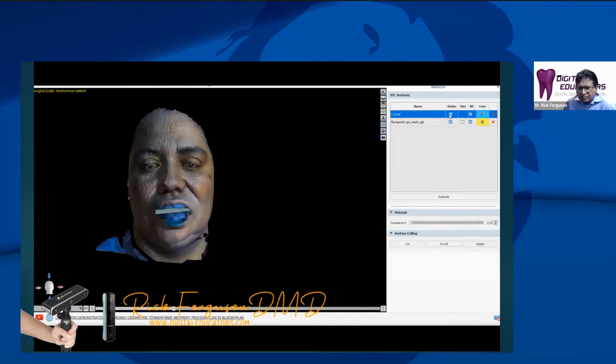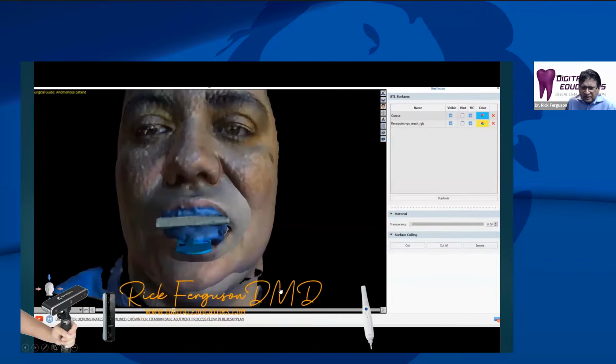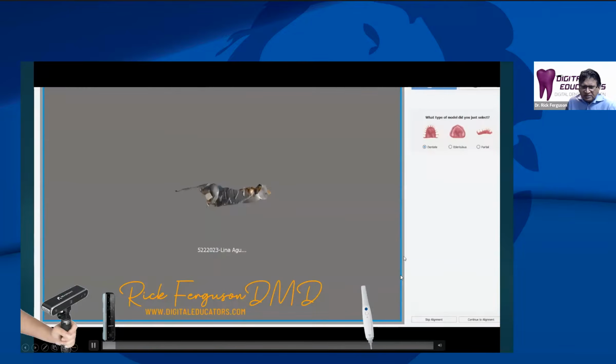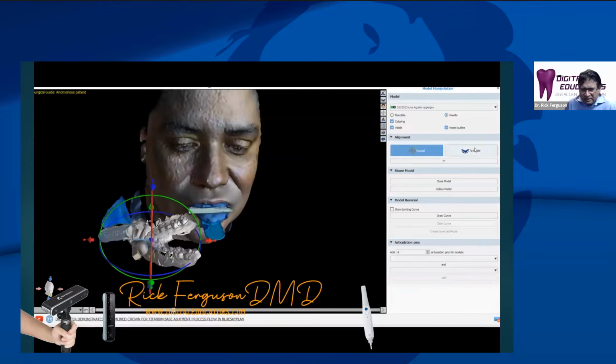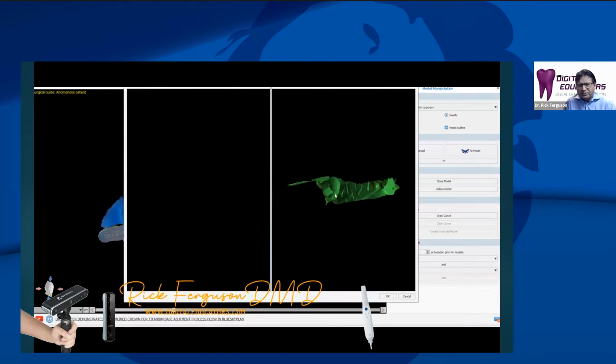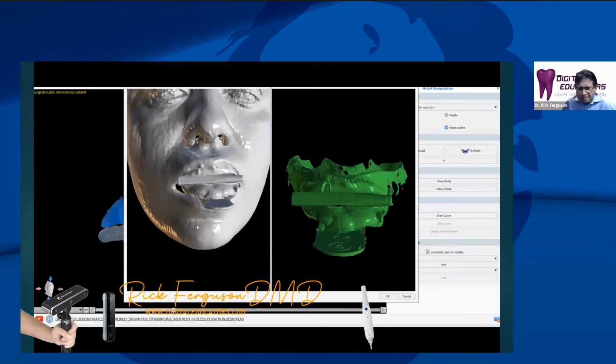And we can go ahead and bring in now our intraoral scan of the impression and align that as well. So that's the next step. Here's the impression, just again, like we did before in Exocad. We're now doing the same functionality, again, using the points matching.